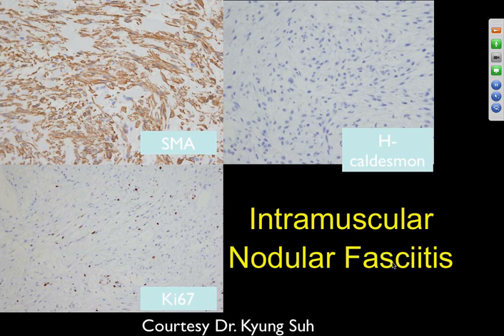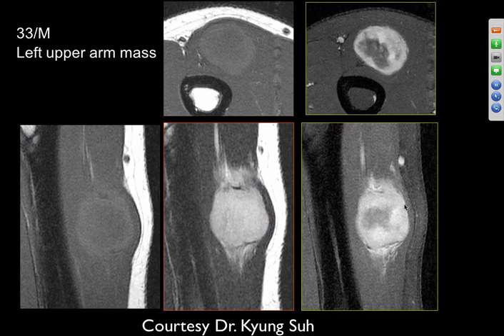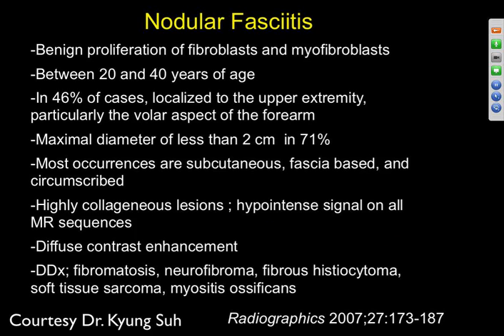Again, a lot of these, I think Schwannoma would be a good one, just looking at this. Though the margins are usually a little bit sharper, it's usually more oval. You usually don't get this edema within the soft tissues. But still, it looks a little bit like a target sign here, so I certainly would think about Schwannoma. But then it'd be a little bit hard to explain the edema around it unless it's turned malignant and is growing or something. But nodular fasciitis can really look like very bad things.